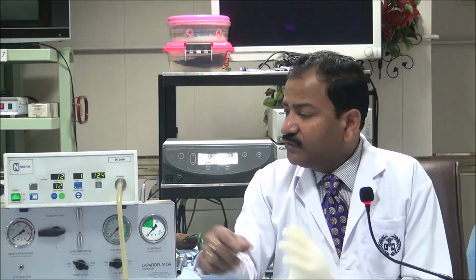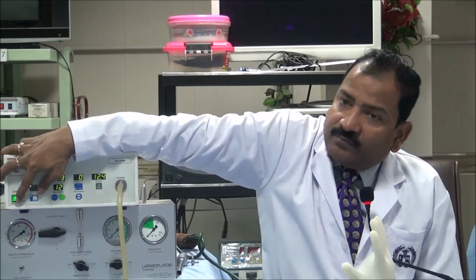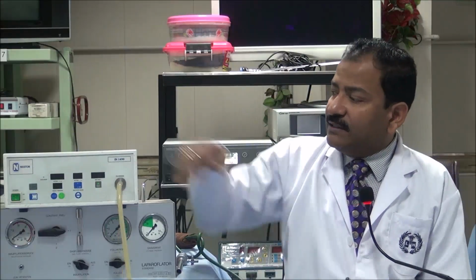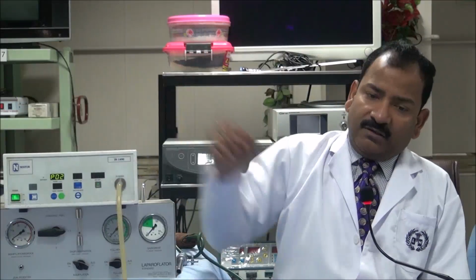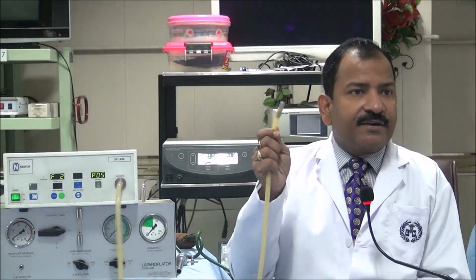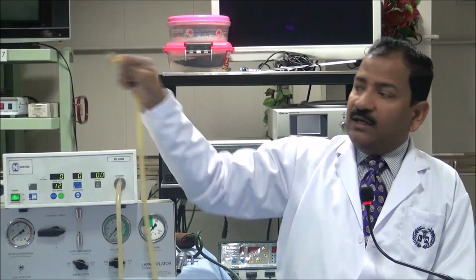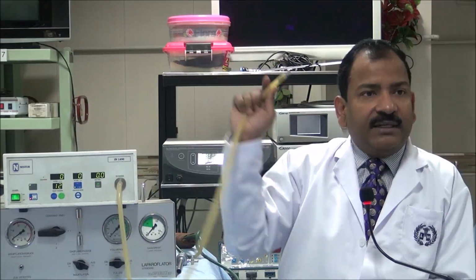And there is only one setting where the actual pressure can go beyond the preset pressure, and that is blocked. I will show you. See, I am switching off this insufflator and then switching it on. Now the insufflator has removed all the circuit. The circuit was drained. Now it will go to standby. It is on standby, and it will remember your last reading, that is 12.